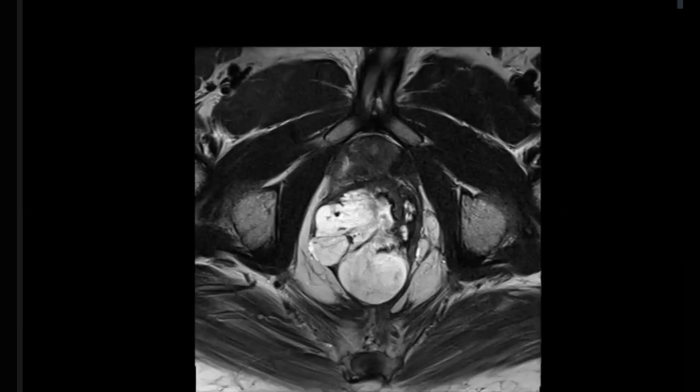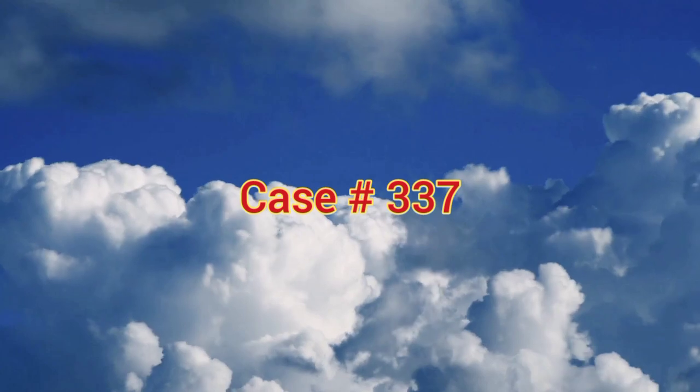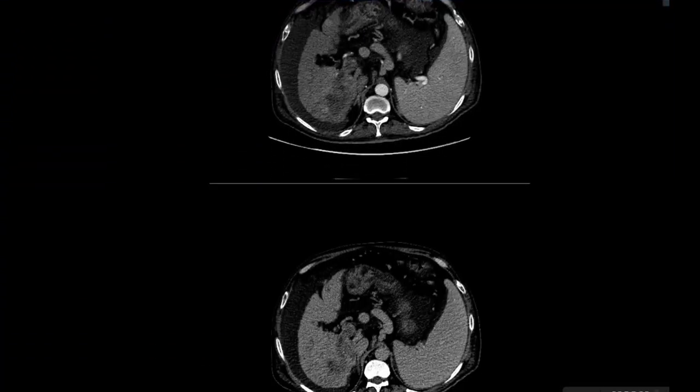Okay, sir. I'm presented with CT scan abdomen axial section images, plain and arterial phase images are provided. In these images, I can see the liver shows irregular margins and appears cirrhotic. The spleen is also enlarged, and ascites is also noted.